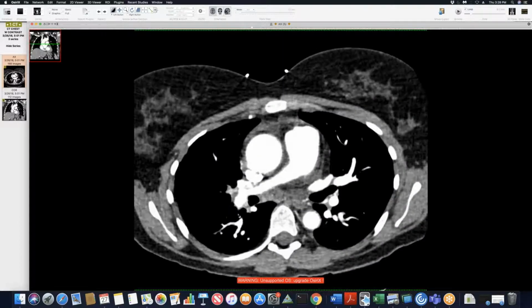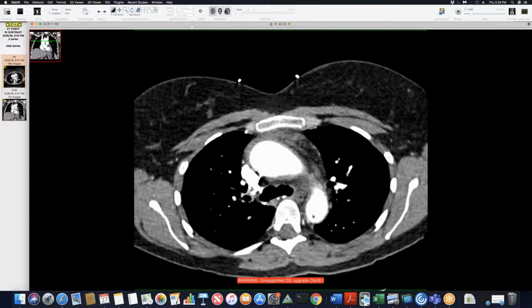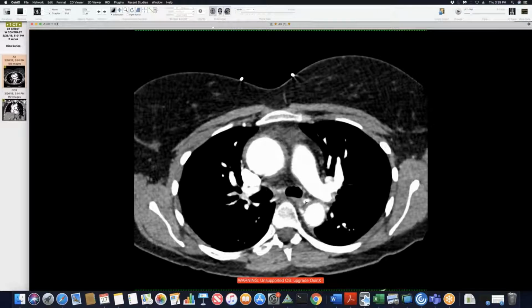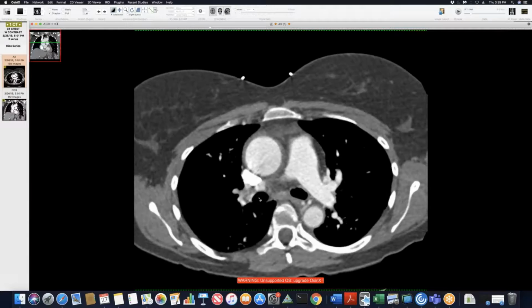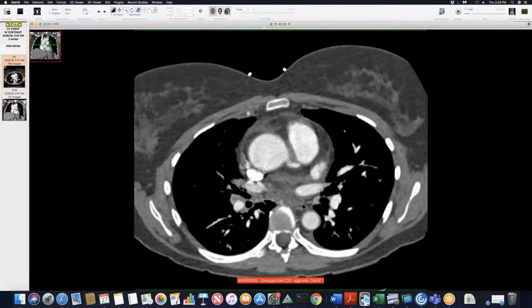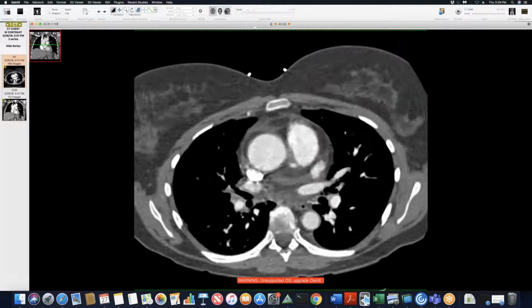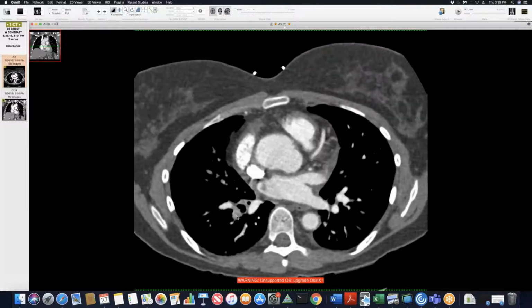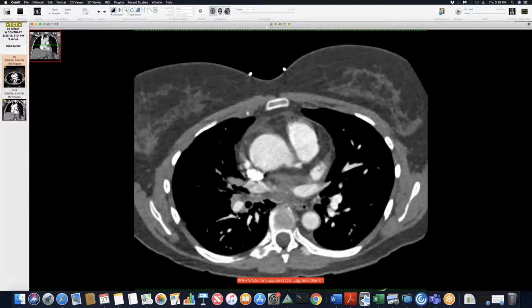So we have an obstructed pulmonary artery, mosaicism, and enlarged bronchial arteries. In certain ways it seems similar to CTEPH in an indirect way, but it doesn't really look like CTEPH, right? There's no web. The filling defects here don't have that look. They're not web-like.